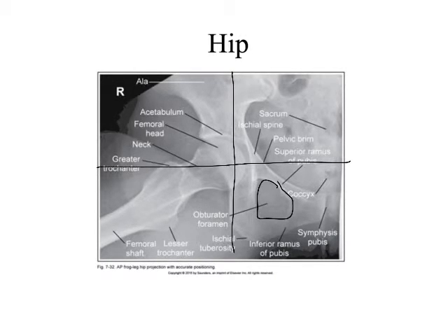What else can we talk about? What were some of the other things we talked about on the last image that might relate to this image? I haven't heard from this side of the room yet. What were some of the things we talked about on the last image that might also relate to this image? The ramus? Yeah, you're right. So we can now see the symphysis pubis right here. So we know that that should be our medial border of the image, right? What else might we look at?